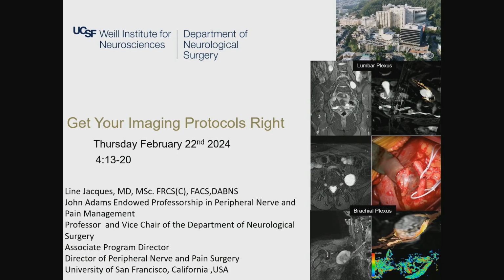I just put a few slides here and some pictures of the lumbosacral plexus, looking at the nerve of origin compared to the femoral nerve. For instance, this tumor was arising from L5 on the left-hand side. And what you can see on the right side of that slide is the tractography, looking at the normal fascicular structures compared to the tumor itself. And that is very useful when you are looking into surgery like this to remove these tumors.